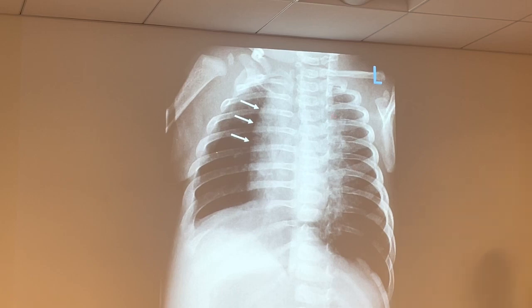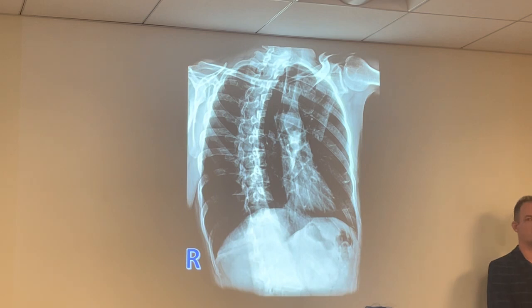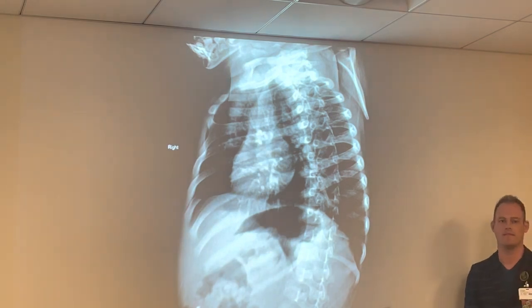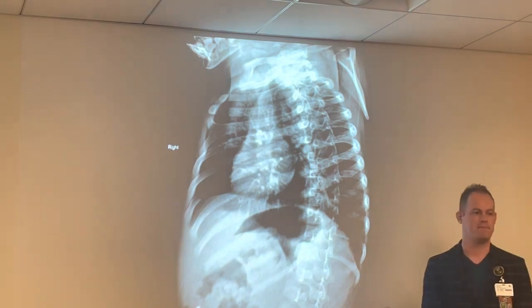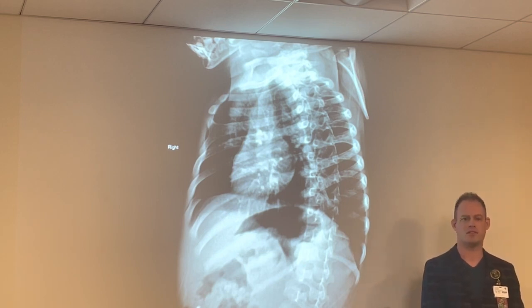Well, let's go back to the start, guys, one more time. What is this and why? RPO. Why? Same side marked and same side elongated. So the right arm is up. Correct. What is this? RAO. Right side is marked, left side is elongated. Left arm goes up. Correct. What about this one? RPO, yes. Right side is elongated. Right arm up. Correct.